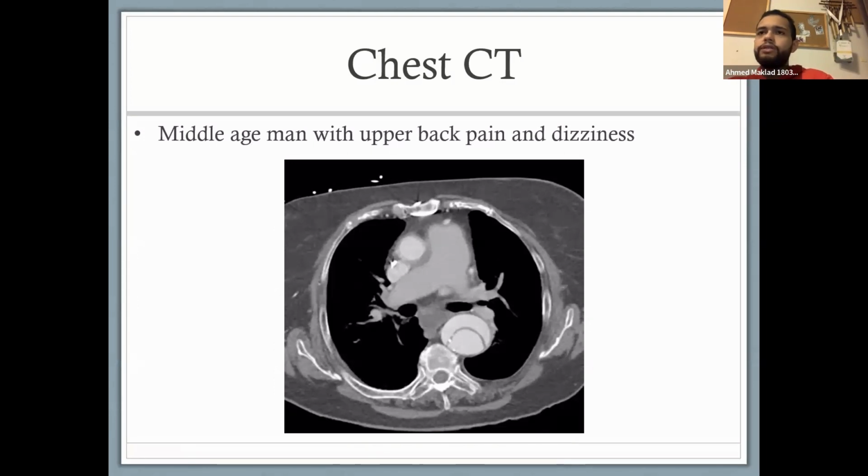And it always looks like this on CT. Different variations, obviously, but yes, you're gonna find something in the aorta, right? You're gonna find 2 lumens in the aorta. That's how you say that this is dissection. The aorta is split into 2 lumens, right? So it's like 2 structures now. It's not only one aorta, it's divided into 2. So you can see you have here the true lumen and the false lumen right here, right?